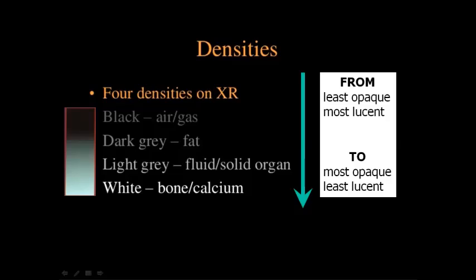All the rest, such as solid organs or fat, occupy an intermediate position and are presented in dark gray or light gray colors.